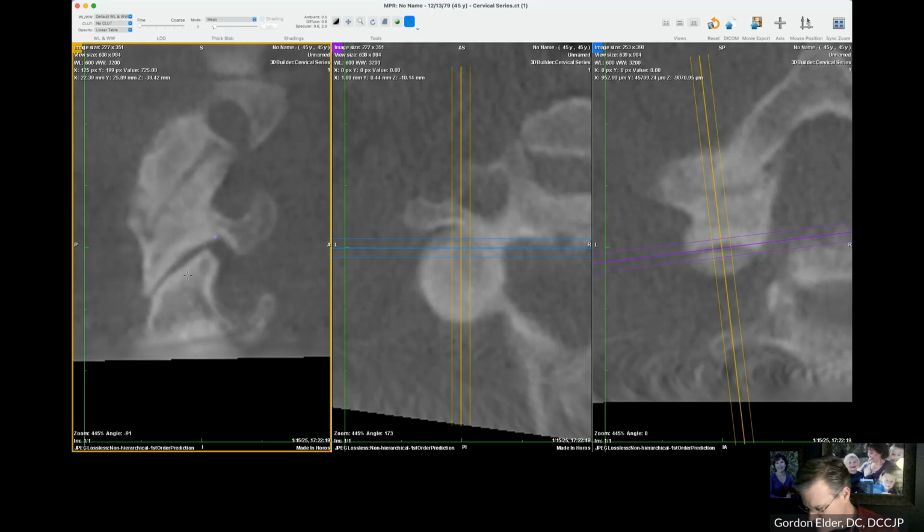Actually, the L doesn't tell us the side of the joint, although in this case it coincides. It tells us the laterality. So if the neural canal has gone forward and up on the left side, the whole neural canal has rotated up and forward towards the left. So the side of laterality is left. It just so happens that when we list it ALS, it's also the side of the slipped joint.